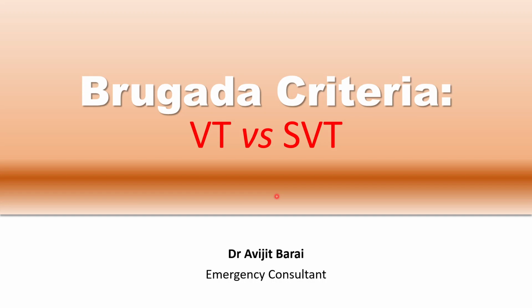In this video, we are going to talk about Brugada criteria. Probably you have seen a lot of ECGs with a wide complex tachycardia, and sometimes it can be very confusing. Sometimes it can be very difficult to differentiate between a VT or ventricular tachycardia and SVT, supraventricular tachycardia with aberrancy or bundle branch block.